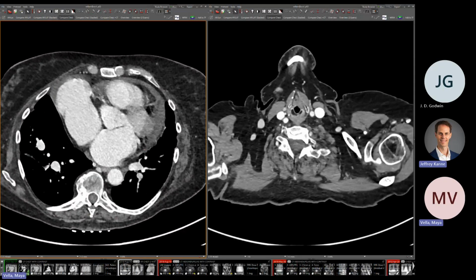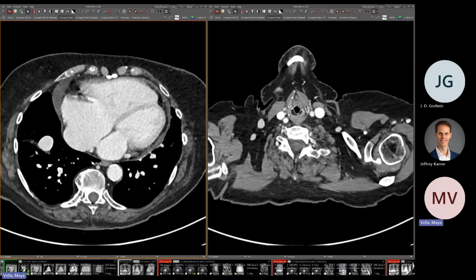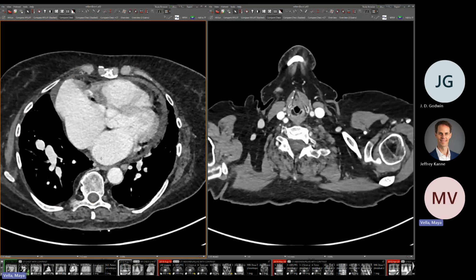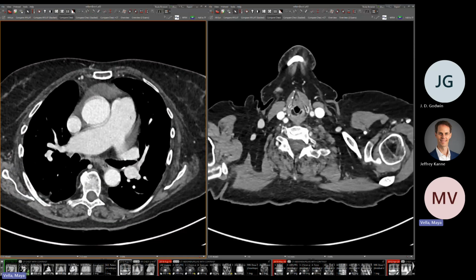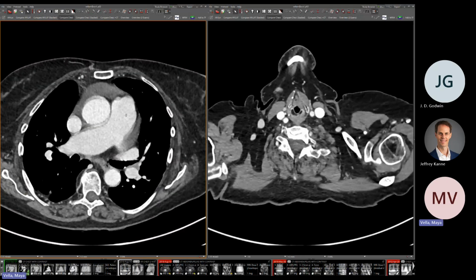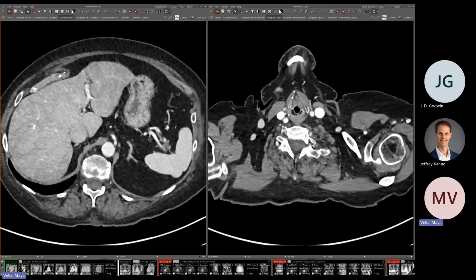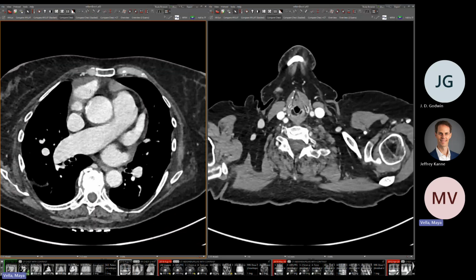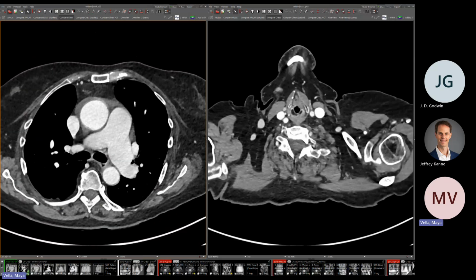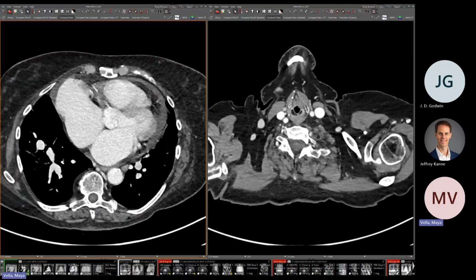And there was another one right there. This one down here, yeah. But the vast majority of the lung, it looks like, is being drained by that scimitar vein. And this person obviously has very enlarged right-sided heart chambers. Their main pulmonary artery is big. It looks bigger than their aorta here. So they probably have some pulmonary hypertension. Their liver looks a little bit nutmeggy. So probably pulmonary hypertension. That, honestly, I would suspect, is maybe the cause of their shortness of breath and their symptoms, and maybe related to this long-standing scimitar.